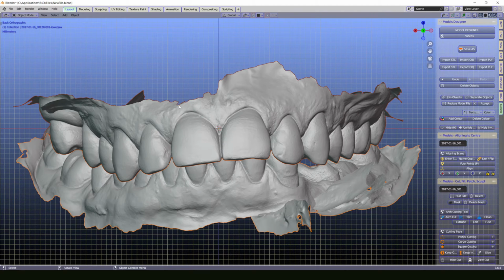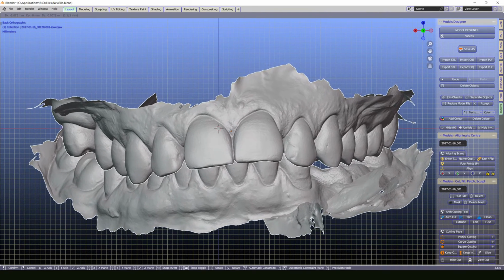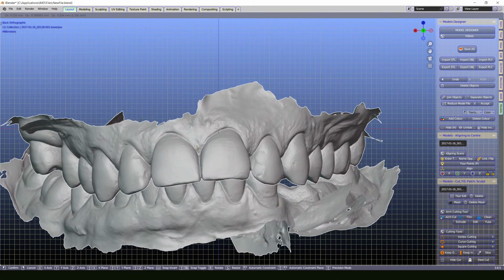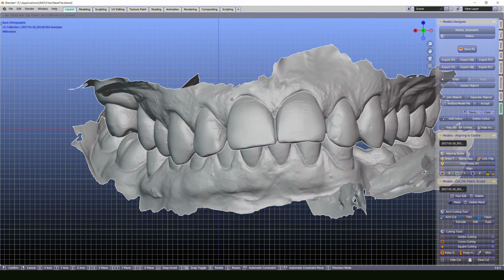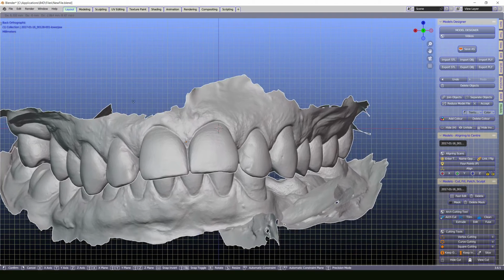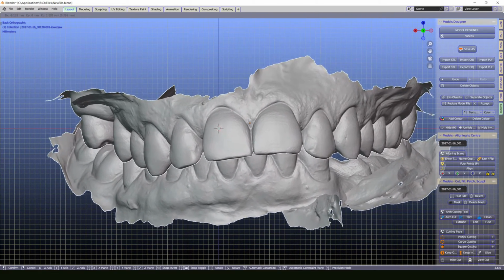And the next thing we can do, if we hold the G button on the keyboard, we'll be grabbing both selected files, and you just move the mouse, no pushing needed, and you can drag the files. But it's not the camera going around the scans, you're moving the scans themselves in the dimension.